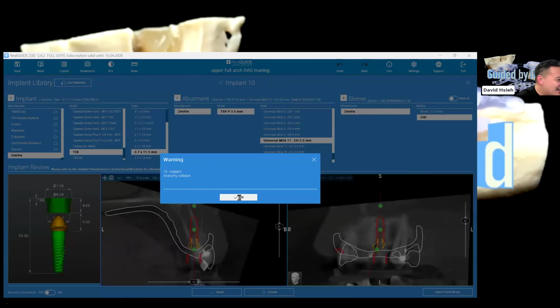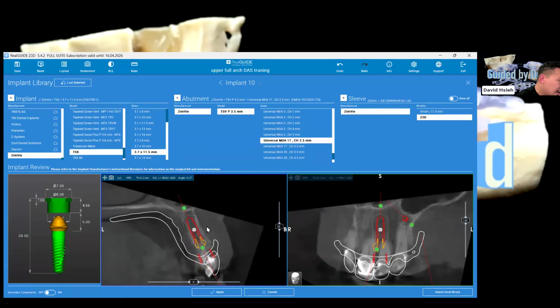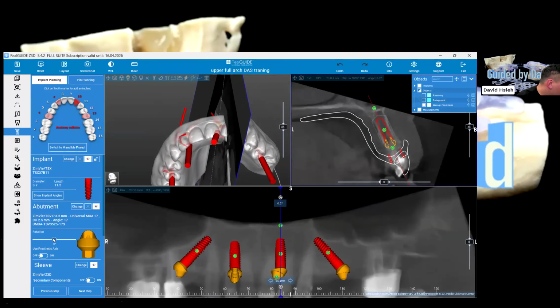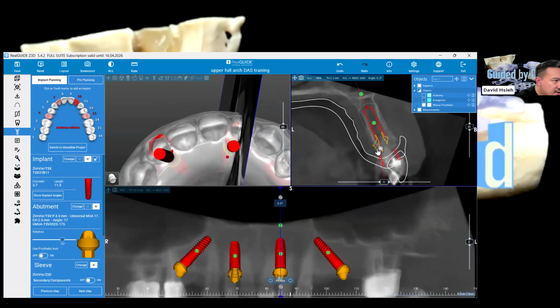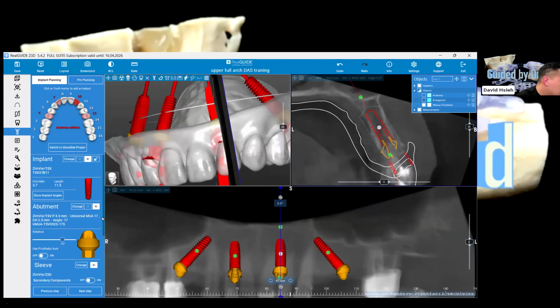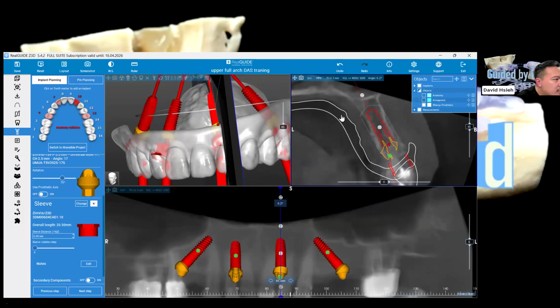This is so good. This spot here, oh my God, see, the bone is very thin right here. If we use a straight right here, I mean, oh, this is a 17 as well. Yeah, that's good. So we can face more like the cingulum right there. Because we use a 17, we can hide the implant more at the posterior, right? So that's very nice. So yeah, pretty much.